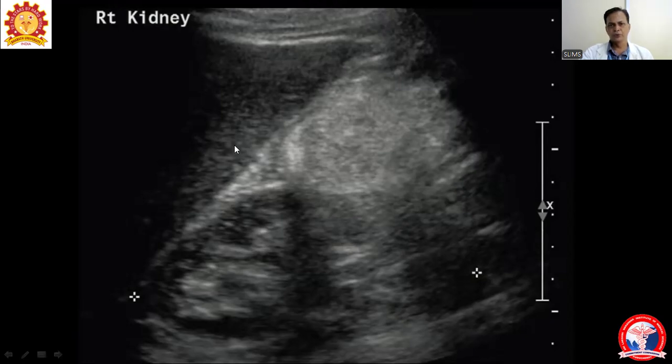As sonography is used for abdominal evaluation very frequently, the most go-to modality is sonography, and patients come for sonography first. Only in very few emergencies, like trauma and severe emergencies, is CT scan the first choice. Most of the time, for the abdominal region, sonography is the first modality of choice. Here we are seeing how this lesion is and how the normal structures are shown.